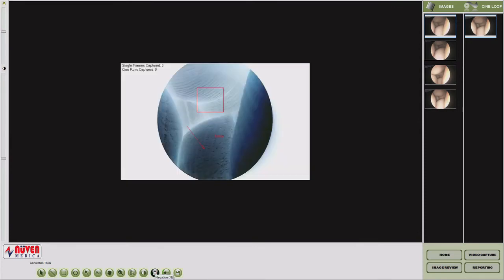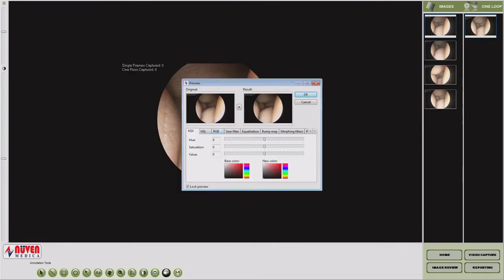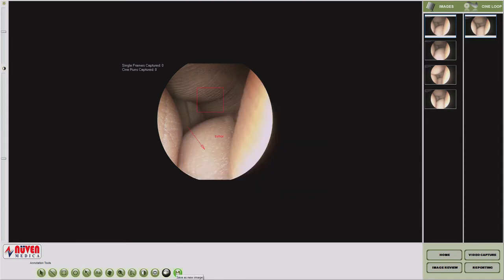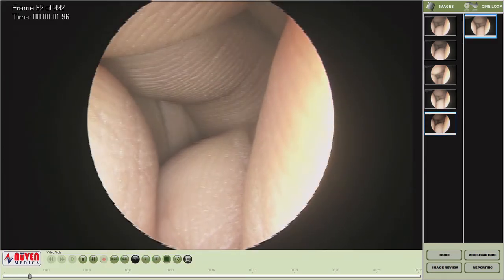Invert image button changes the image to a negative color to see the image details more accurately. You can also click the next button to view and change more of the contrast and the image colors, RGBs. After changing all the image annotations, you can click save to add it as a new image, which will not override the existing image. It will add as a new image in that image column.